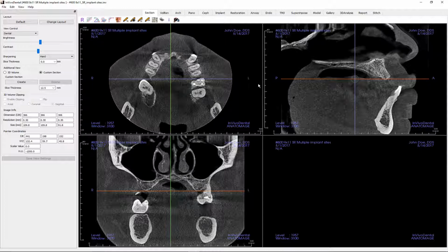Before we begin our navigations through these sections, let's talk a little bit about patient positioning. While your practice was taught the importance of patient setup when you had your initial training, things can go wrong. The operator may have positioned the patient incorrectly, or there may have been some anatomical limitation that prevented correct positioning. Additionally, the patient may have moved after setup and before the scan was taken. Regardless of the cause, the toolbar reorientation function provides you a way to reorient a volume through each orthogonal view, sagittal, coronal, and axial, before you begin case planning.